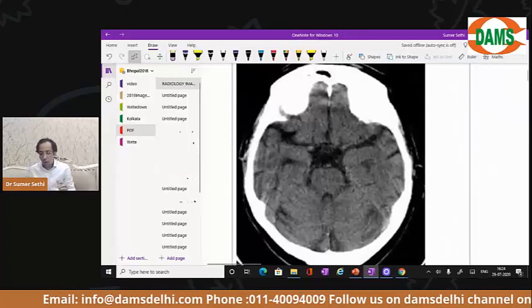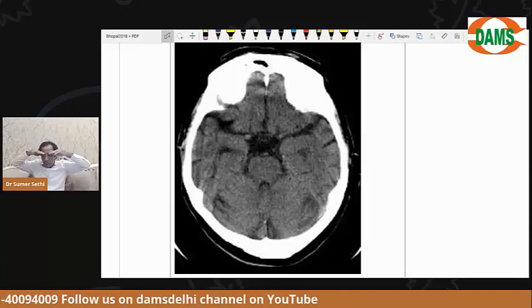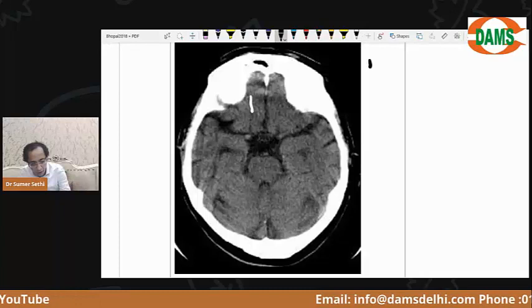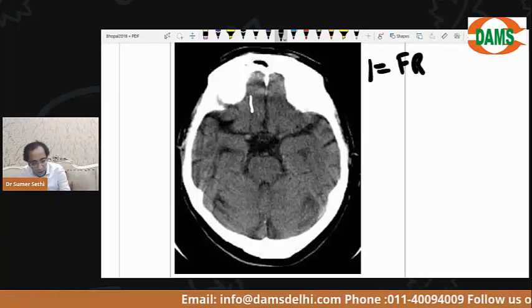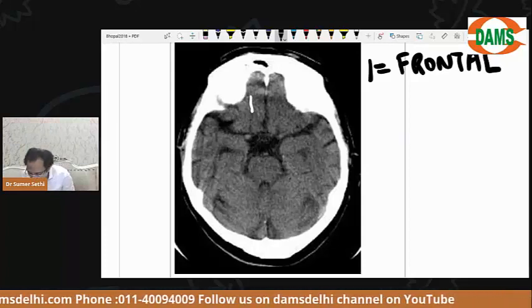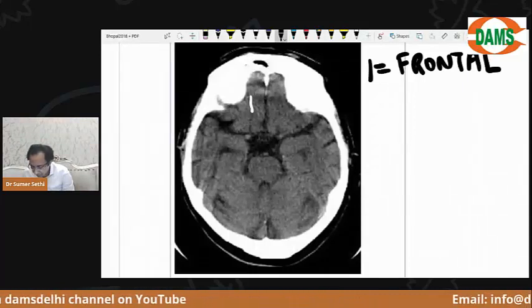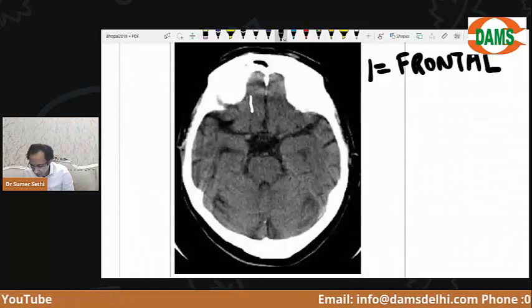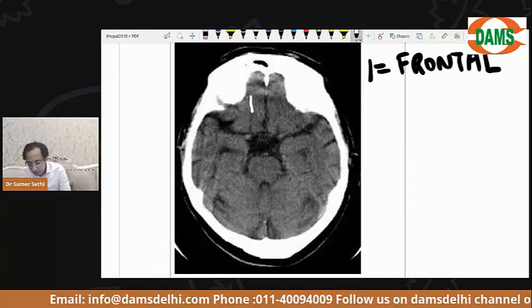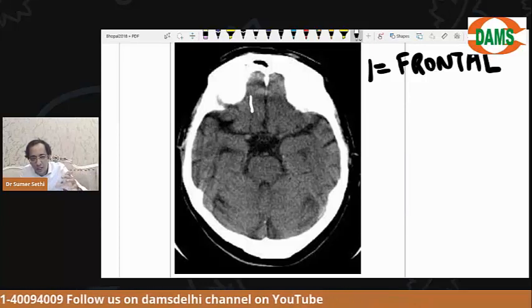Now let's go to the section above it. What I'll do is I will go a section above. So we were at the first cut, and now I'm going above it. Now, when I put a 1 here, the 1 is your frontal lobe. Listen to me, everybody, in the first section we could only see the temporal lobe because that is at the inferior part.